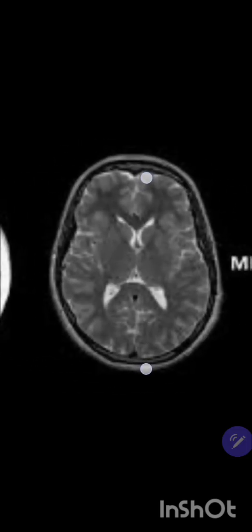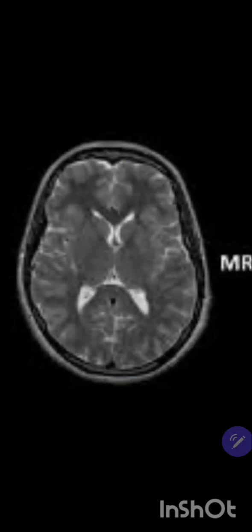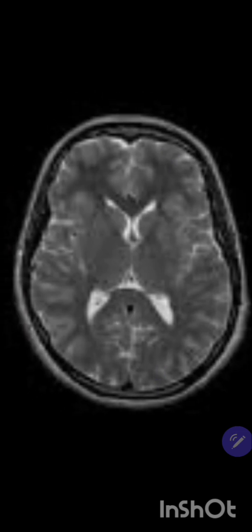And MRI is called magnetic resonance imaging. In this, magnetic fields and radio waves are used, best for soft tissue observation. If any tumor is present, or any malformation, we can observe it, and it is especially concerned with the different functions of the brain.